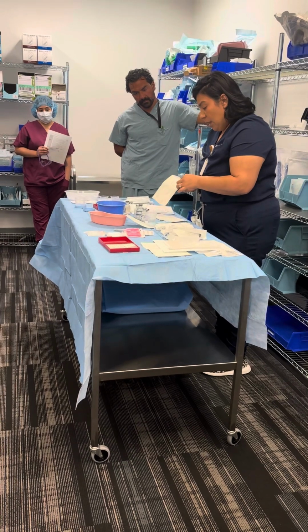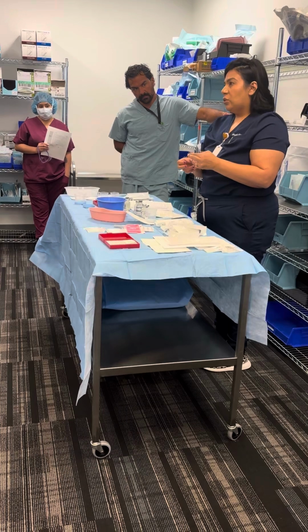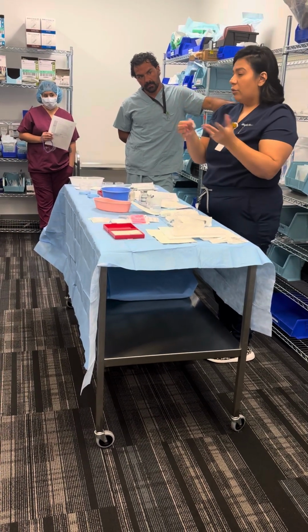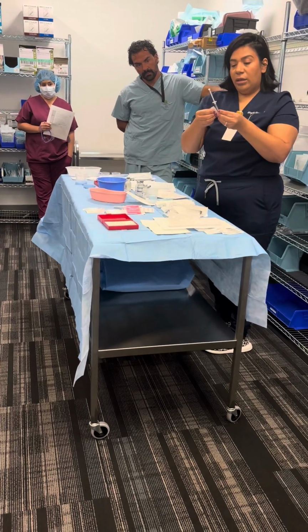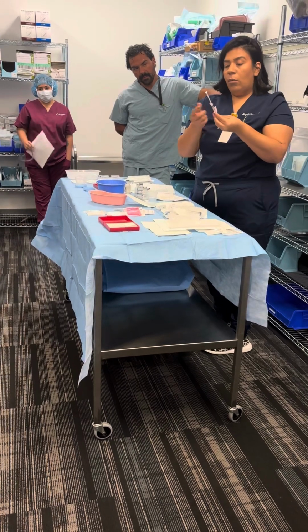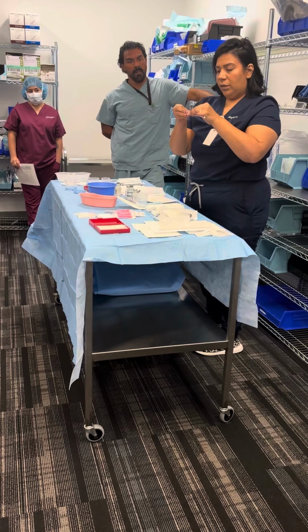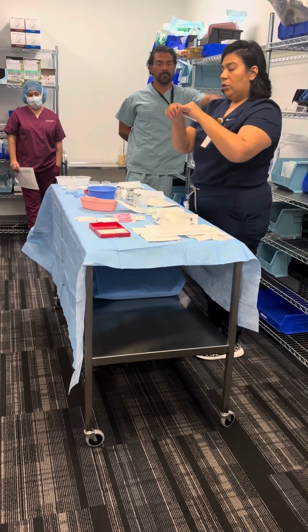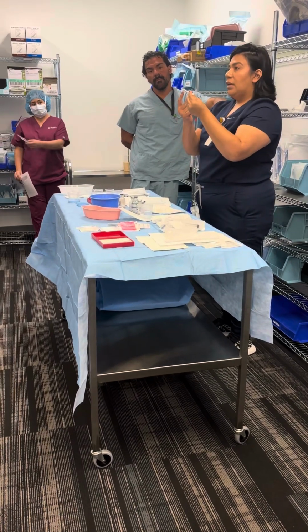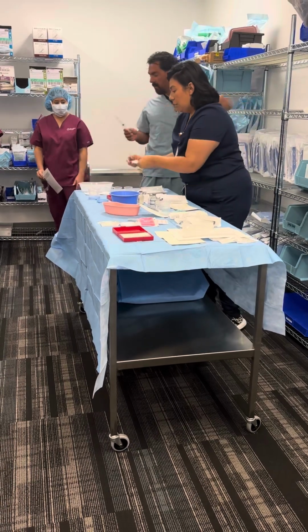Because it's so little, I grab a pair of scissors, and this is probably just because I'm extra, okay? I'm gonna cut this label in half so that I have 2 labels for any other syringe. And I'm gonna label it where it says single use only. I'll do it in half this way, so you can kind of see what I mean. So I'm gonna label it like this, so that my numbers are still showing. I have the name of the medication and the expiration date. And then there's the little one.